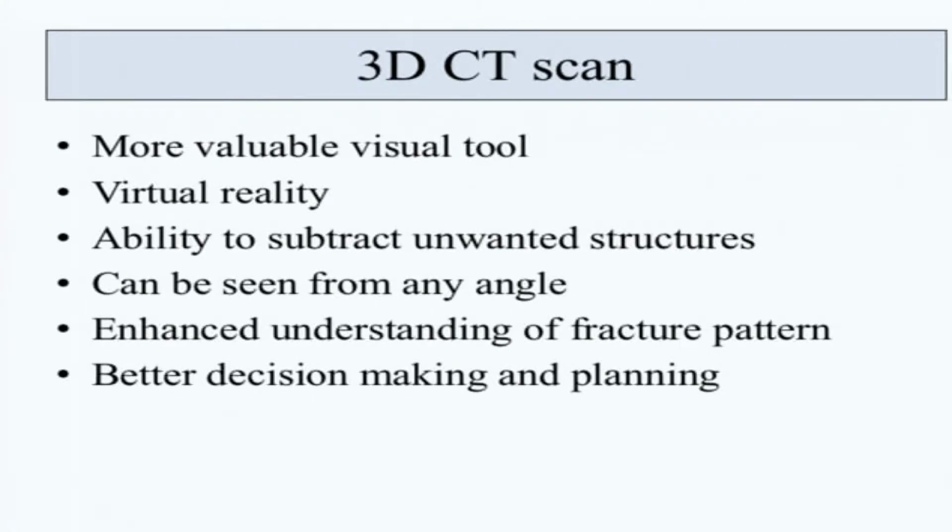It's a more valuable tool. It gives you virtual reality. You can create the model, you can see the bony model, you can play around with it, you can subtract unwanted structures, you can view it from any angle, and it really gives us an enhanced understanding of the fracture pattern.